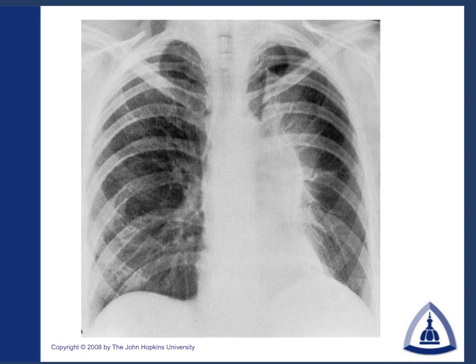And then this is a classic x-ray of left upper lobe collapse. What you see here is this fuzzy area in a straight line. This is the left upper lobe sort of coming out at you and collapsing. And in general, this is caused by one thing and one thing alone, and it's usually cancer. Okay, either intrinsic, a malignancy or mass inside the airway causing collapse, or extrinsic compression of the left upper lobe bronchus. And this is a classic x-ray of left upper lobe atelectasis, collapse.